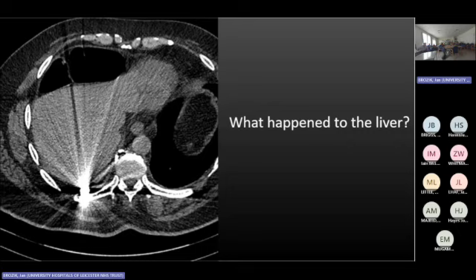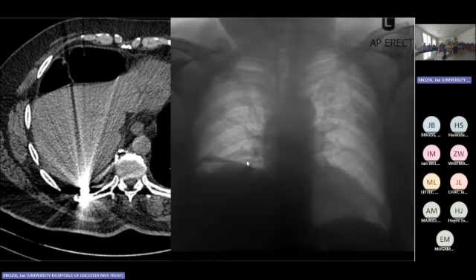So sometimes it feels like chest X-rays are dead. We'll do CT. Why bother with X-ray? So we did chest X-ray, and now you can give me your diagnosis. A bullet? It should be just a knife. Yeah, not a bullet. Yes, but people travel around the globe, and some of them are bringing shrapnel and projectiles in them. But I just wanted to demonstrate.